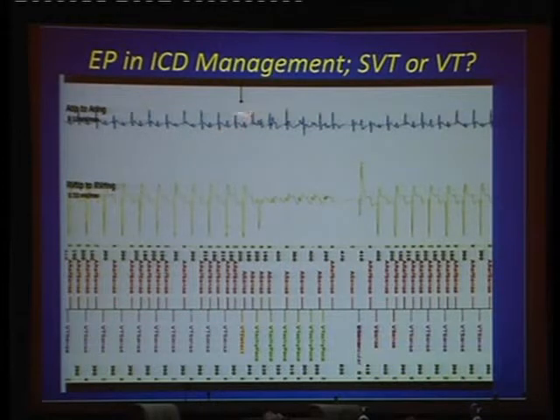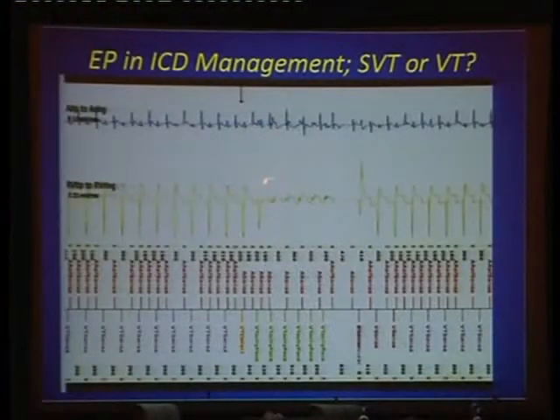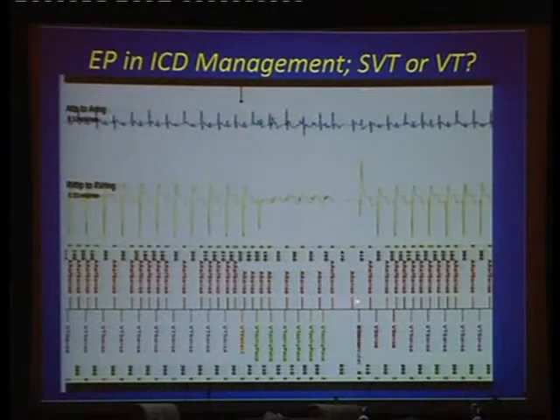And if you follow the A, you can see why there's oversensing in the atrium because of the V. If you follow the A, the last two are accelerated. So in fact, you're able to accelerate the A to the V pacing rate, and the next thing that happens is an A. So in fact, here is failed ATP, which shows a VAAV response. So you need to be, I hate to say this, but you need to have electrophysiology training.